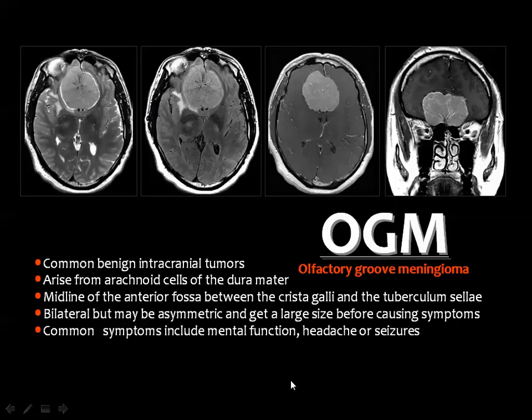And meningioma in the olfactory groove, known as subfrontal meningioma, will simulate any meningioma anywhere. It's commonly a homogeneously enhanced lesion of intermediate signal in the T1 and T2 weighted image. And sometimes you can see the CSF cleft sign, which is an indication of extra-axial lesion. And I have explained this many times in the lecture of brain tumors.